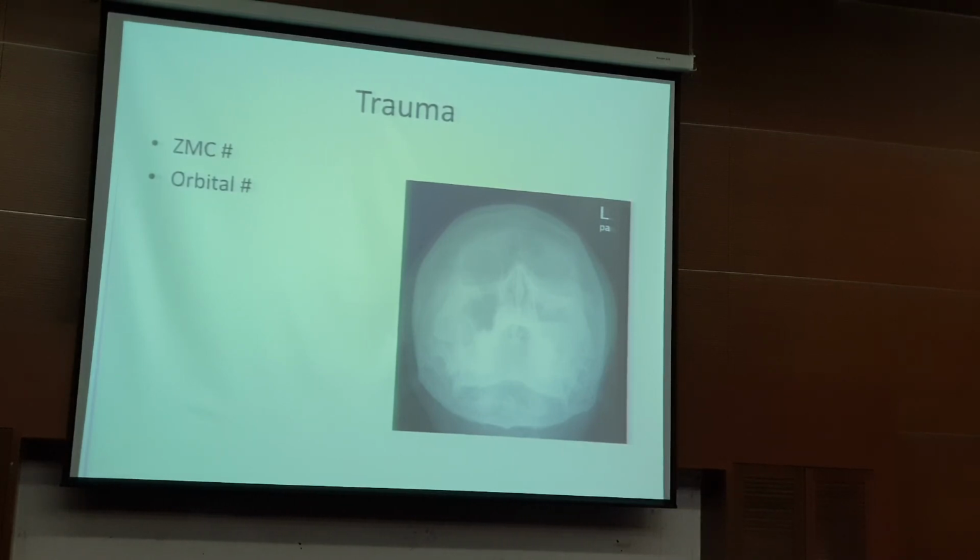The rule of plain radiograph is to compare right and left. Just compare right and left. Like this we can see that there's an air fluid level. Do you see anything extra? Yes, teardrop sign. That's a teardrop sign. So there is fracture of the inferior orbital floor with herniation of the orbital content into the maxillary sinus. So this is a blowout fracture.